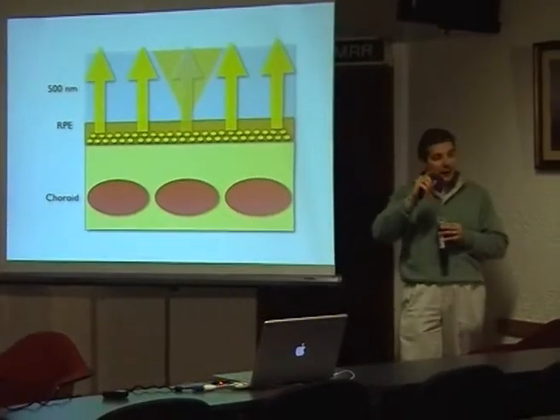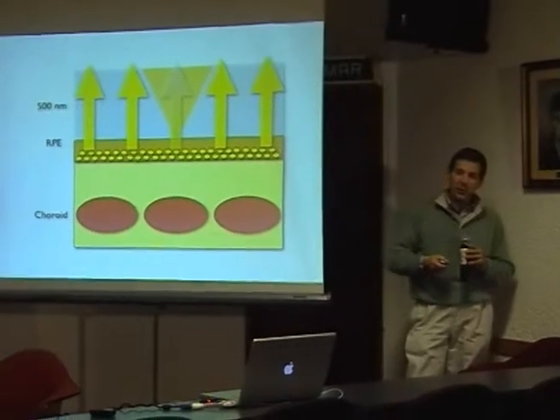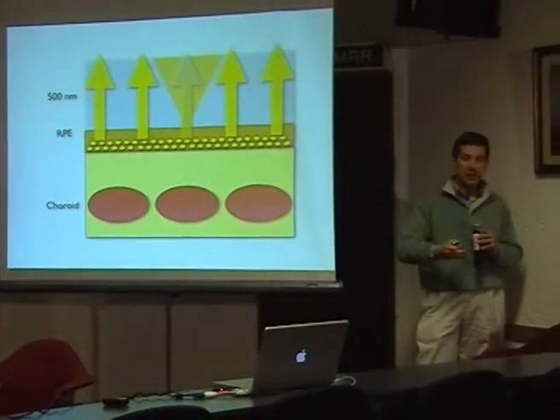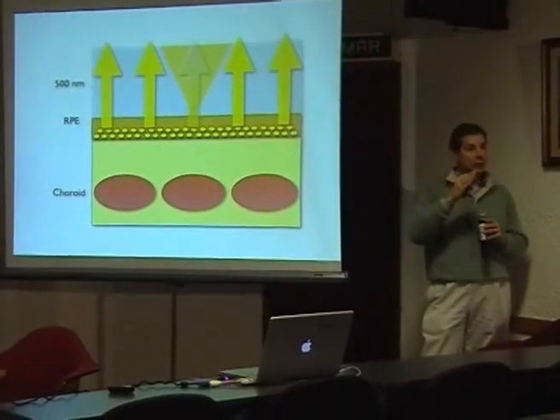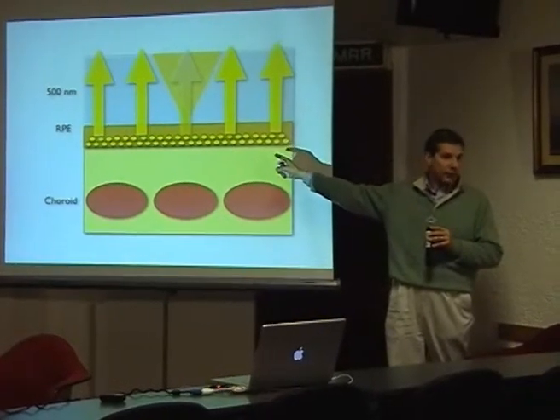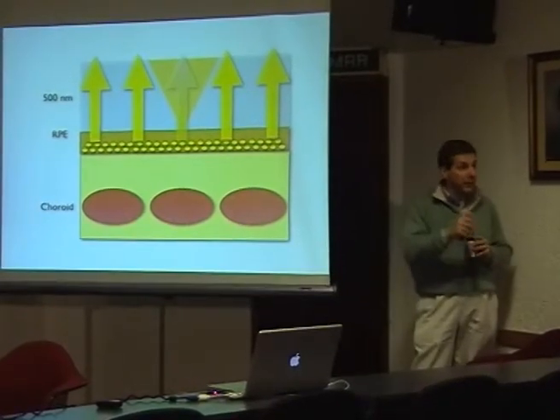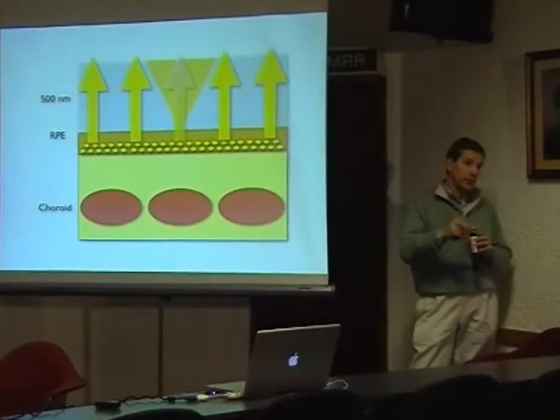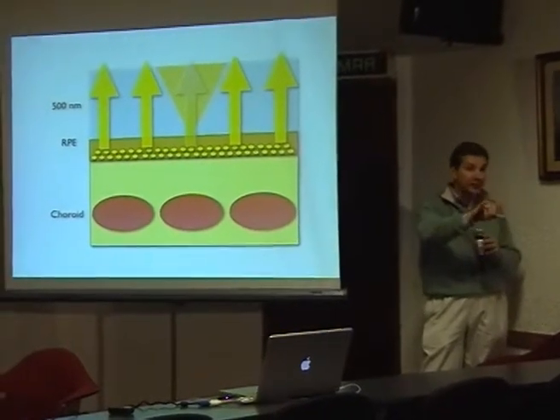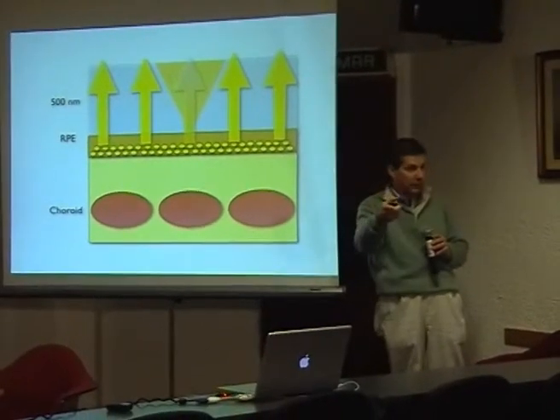Now, it's a little bit more complicated in some way because there are different types of autofluorescent image. So right now we like to call the 488 autofluorescent, that is this one. Then we have the near-infrared autofluorescent, that is exactly the one that you can get using the ICG filters, excitation and barrier filters.